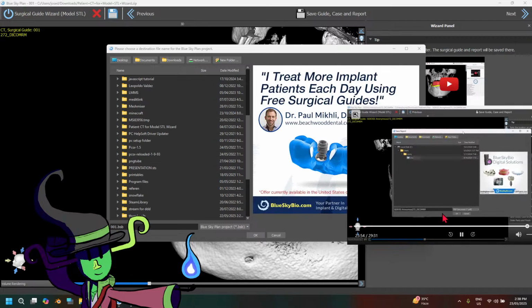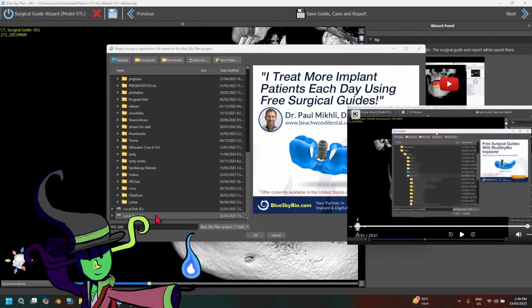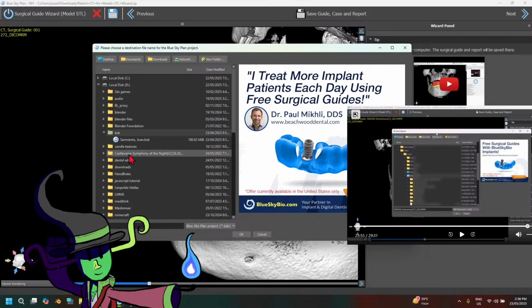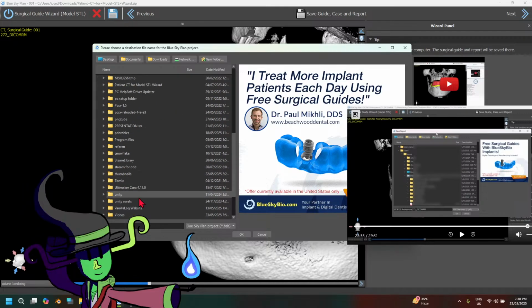And then it's going to ask you, where would you like to save? Okay, I'm just going to go save this. I swear to God, if this should cost money or something. I'm just saving a project file, Blue Sky, not an STL file. So this better not charge me with anything. So let's go ahead and make a file here.